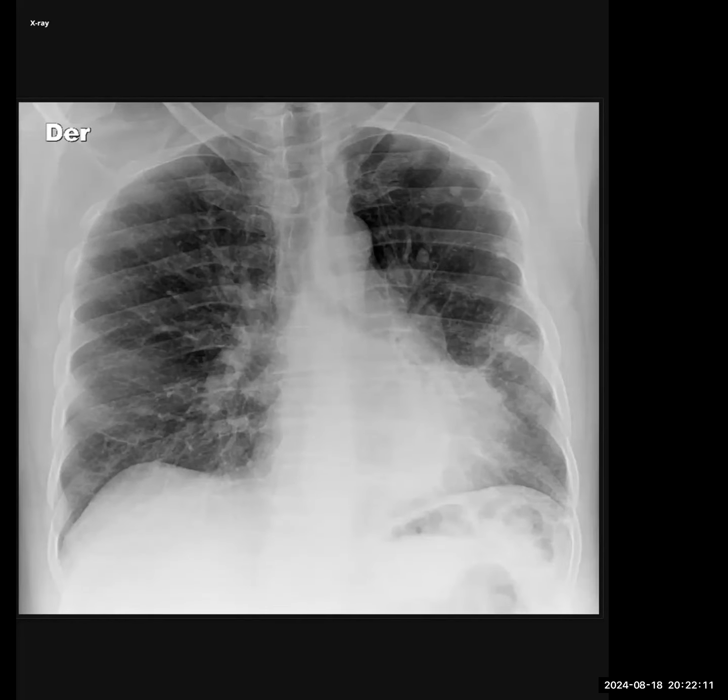I'm presented with the frontal radiograph of a 55-year-old male who's presented with chest pain and dyspnea. I can see that bilateral lung fields show diffuse reticular patterns, more pronounced in the bilateral lower zones.